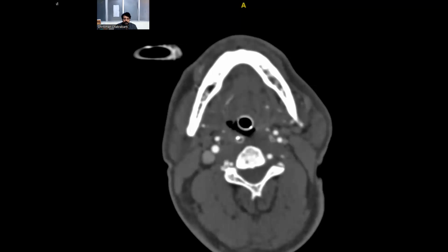If you want to study the arterial architecture, at least get an idea of what it looks like in your mind, you should look at the MRI images, which give a much more detailed view of the arterial architecture. Especially you want to look at the T1 scans, which have gadolinium contrast in them and with thinner slices.